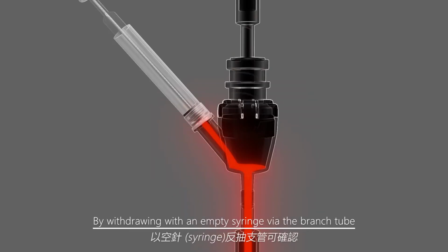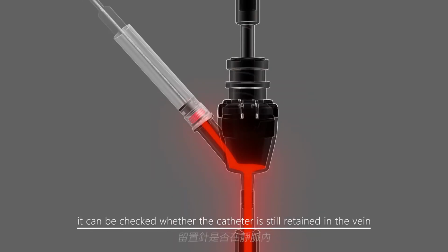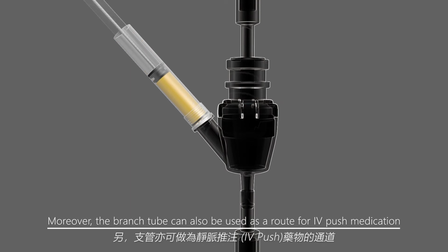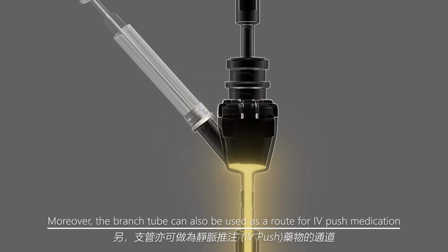By withdrawing with an empty syringe via the branch tube, it can be checked whether the catheter is still retained in the vein. Moreover, the branch tube can also be used as a route for IV push medication.